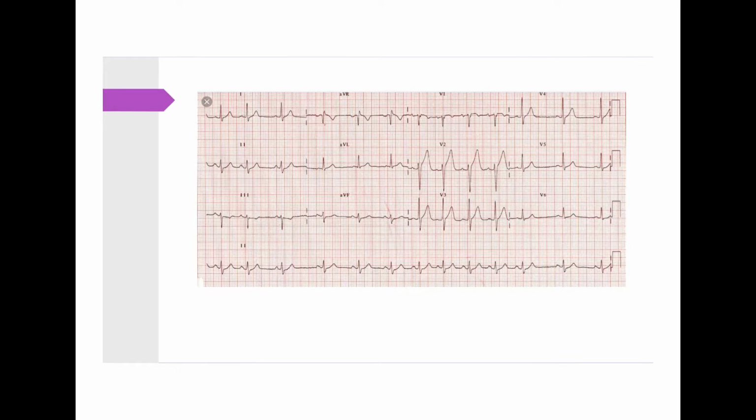Here's an example of when a sinus rhythm can be irregular. It's called sinus arrhythmia, and it's a normal physiologic response, especially in young people. So just with breathing in and out, their heart rate slowly varies over time. And you can tell that it's still sinus because the P waves in lead 2 are upright. They look normal morphology, and all of the P waves look pretty much the same, which tells you that it's most likely coming from the sinus node, but that with variations in the respiration, the distance between the QRS complexes is changing. Okay.